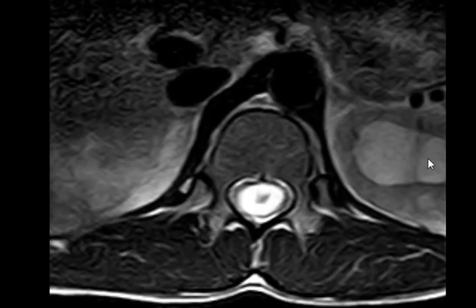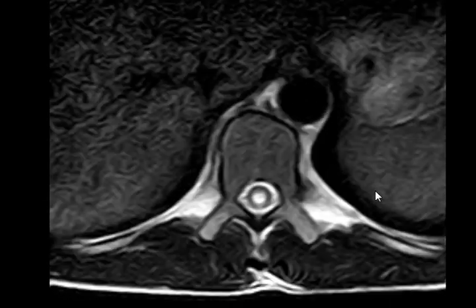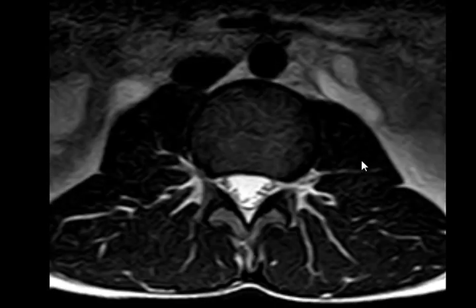What do you have here? Cystic lesion. Where? Bilateral hydroureteronephrosis. Scroll down in the images, not up. Do you see the ureter? Sorry. They are big, they are dilated. Both kidneys are hydronephrotic. These are not cystic lesions.